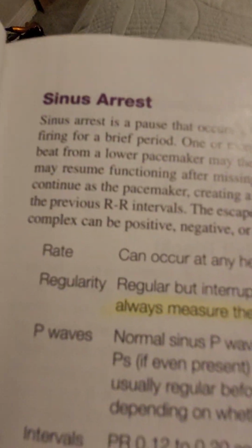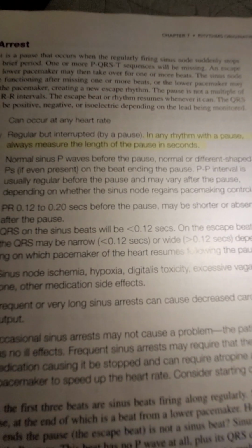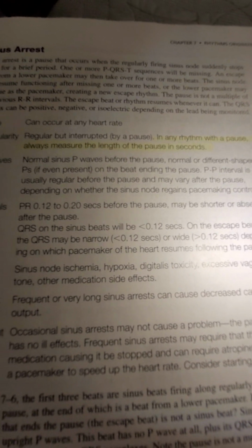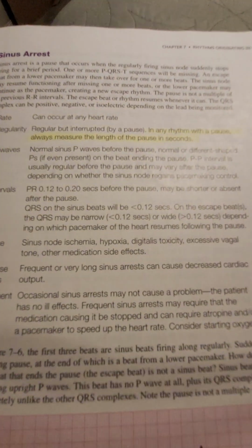So when there's a pause, or what they call here sinus arrest, you won't see QRS. They'll be missing. That's a pause. I just call it a pause. I don't know. I can get questions and then I can ask somebody else what they think.